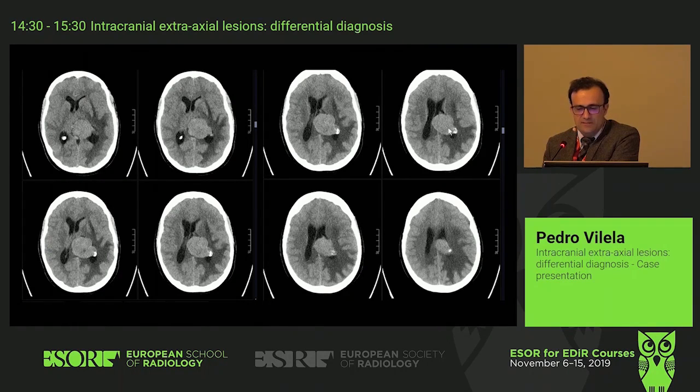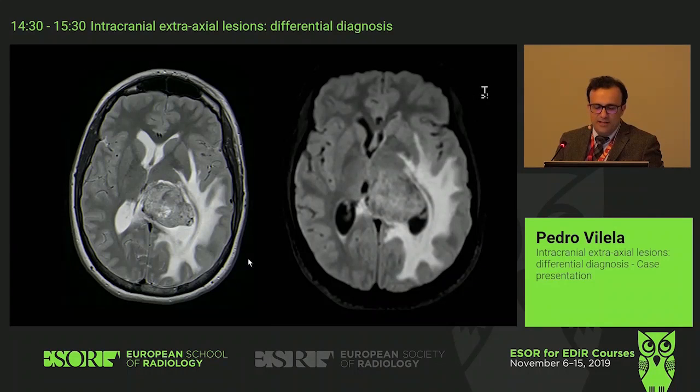Yeah, and calcified, okay? And it's an adult patient, so all those pediatric tumors are out of our consideration. But you are right. Do you want to see anything else more? Yeah, coronal, or I give you the MR. Can you comment on the images that we have?